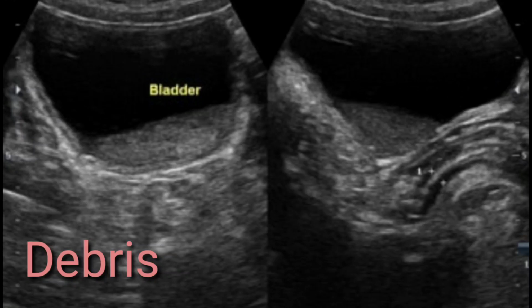Sometimes you come across both radiological patterns in one cystic lesion, or sometimes there will be a single one, like in this case. It is a urinary bladder and it has this content downward, and if you examine its urine, you will see there are multiple RBCs and multiple pus cells.